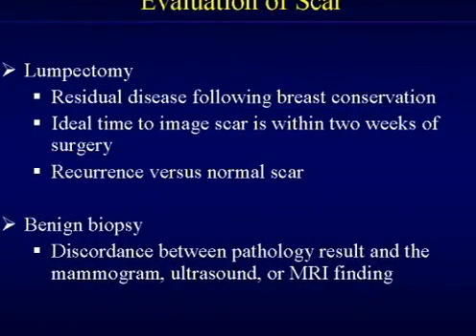So now let's talk about evaluation of a scar. This is really twofold. One is the patient was just operated on, and you are looking for residual disease. The surgeon comes to you and has a path report showing positive margins. And really the ideal time to scan in this case is within 2 weeks of surgery. That's before you have extensive granulation tissue that will set in.